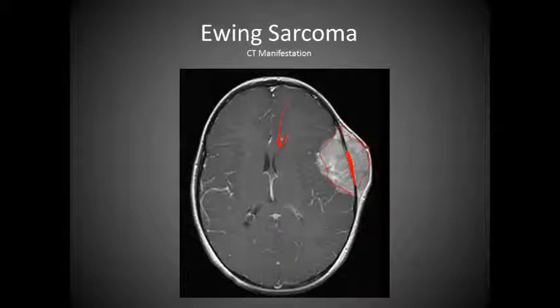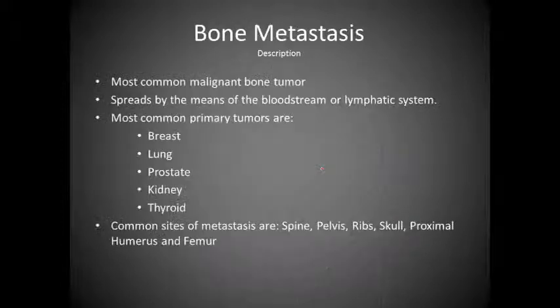We might have compression of the anterior horn of the lateral ventricle, but not a whole lot, not an amount of shift that you would have thought. But typically what we're looking for is just bony erosion, in which we have a clear, definite portion here.